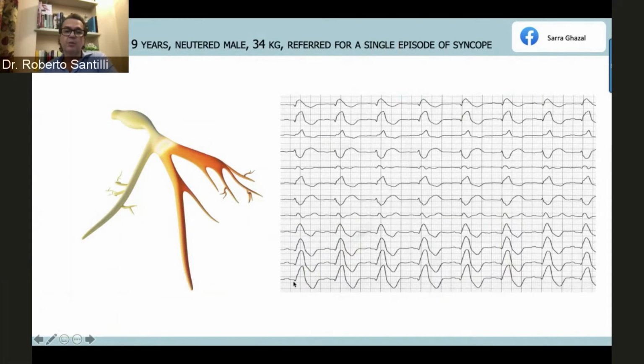What is very important, remember that we already discussed in other rounds the R peak time. You see the peak of the R in lead V1. So this is V1, the lead of the right ventricle. You see it's very early compared to the peak of the R in the left precordial leads. So here it's a long distance between the R peak time in lead V1 and in leads V2 to V6. So again, 1, 2, 3, aVR, aVL, aVF, V1, V2 to V6. This is usually using our system.